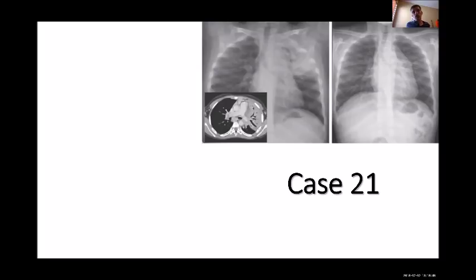I think this is before and after treatment. This is a poor aeration in the left upper lobe with tracheal deviation to the left. I won't say a big deviation, right? It's still in the center and the clavicle looks okay, but I agree with you, the inflation on the right is more than on the left.